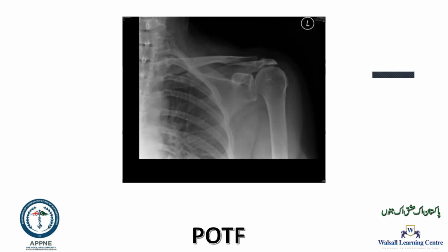No. Yes, sir. Oh, that is not convincing, your yes, sir. So this humeral head is not facing the glenoid properly. Can you see that? So if you draw a line.